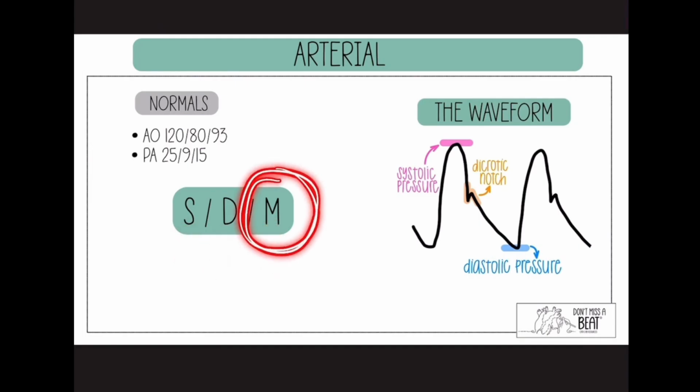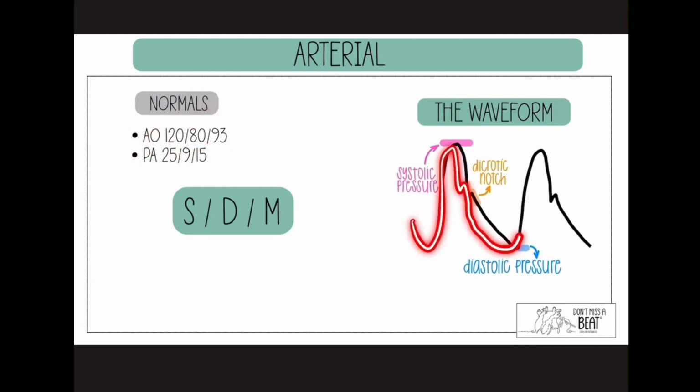This mean is more the mean you know because you're used to probably calculating MAP, mean arterial pressure, and for the PA, that's just MPAP, mean pulmonary artery pressure. Exact same formula, you just are pulling the numbers from two different places. And this is the waveform, which you should be also used to because it's your AO waveform or your A-line waveform, because wherever you are in the body, the amplitude might be a little different, but the components are the same.